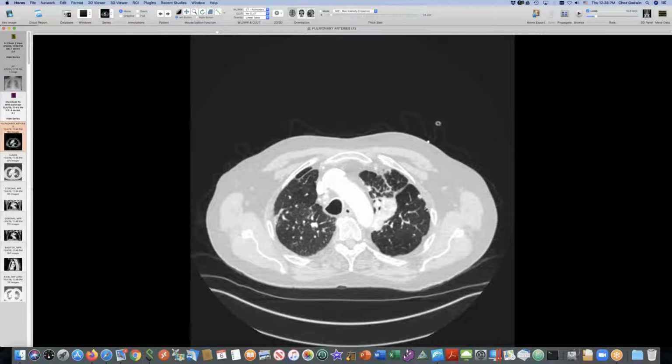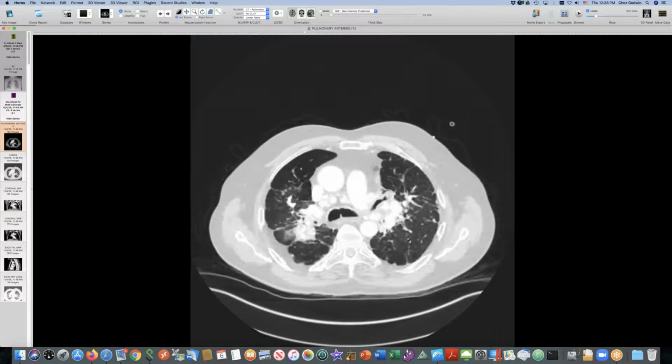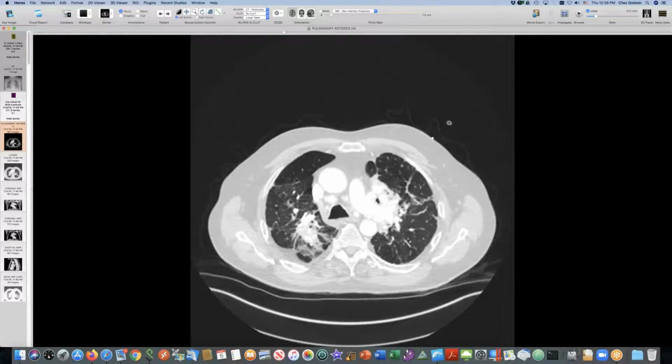No, that's great. I'm gonna have to go back and look at my sarcoid because it's interesting. Those nodules that you showed were very stellate, which to me is much more typical of sarcoid. And in silica, you tend to get usually a little bit rounder nodules. I don't think I've seen in silicosis such nice galaxies. No, that's what I'm saying. They're kind of little spiculated things, whereas I usually see with pneumoconiosis the nice round, even though they're perilymphatic, they're rounder. Yep.